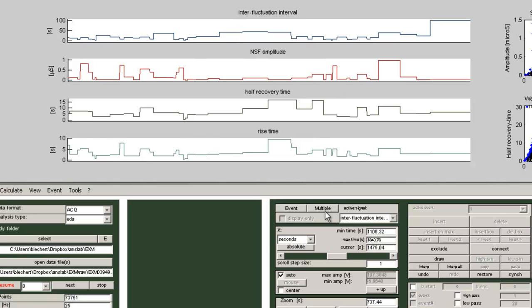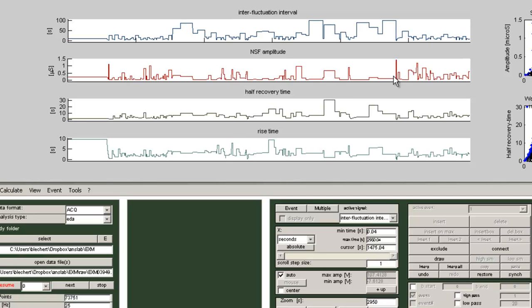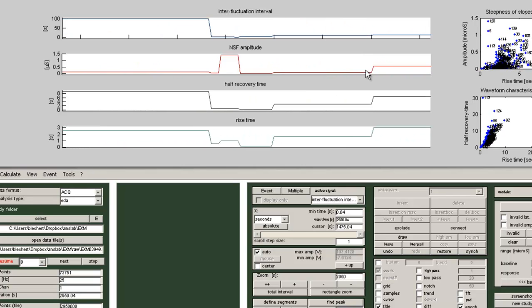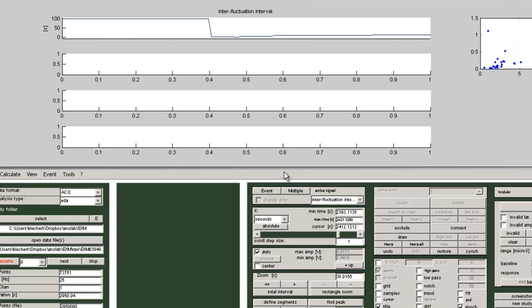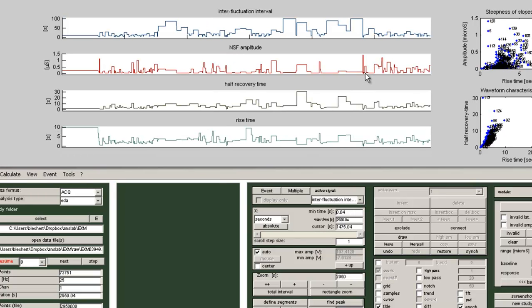Looking at the resultant data in a total interval view will highlight the outliers across the whole file. We could then target a few of them and just check them by zooming into this part of the data and switching back to raw, like here, where there's a huge jump, which will then result in these peaky amplitude measures.